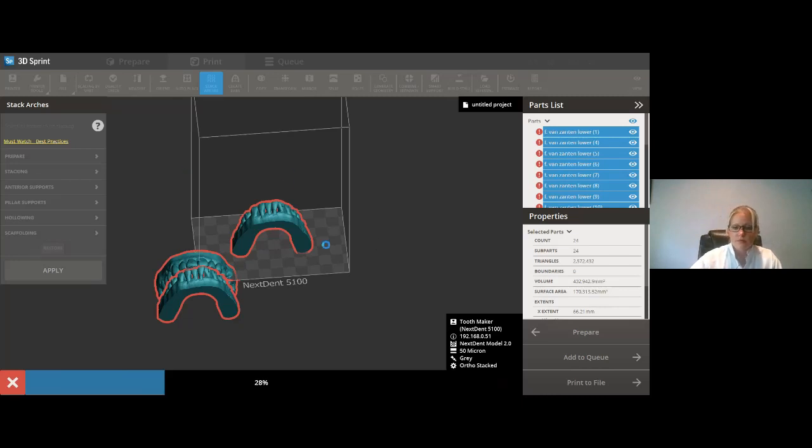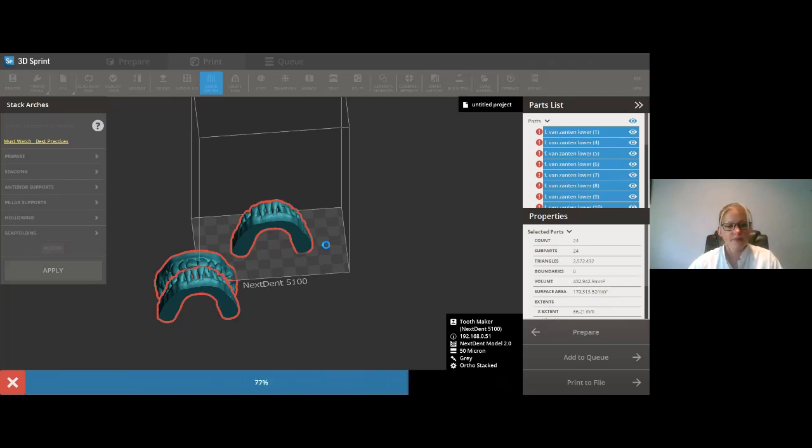While we're waiting for the calculation to be finished, there is one question that came in, a smart question. Why do you use different shrink compensation for X and Y axes? All our materials have, of course, the scaling factor that you can see on the screen also. And the question is, why is that different for X and Y? I have an idea, but Adrienne, can you say something smart about that?